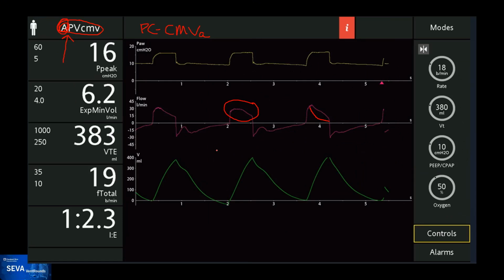But this mode is still composed of mandatory breaths. There is a set inspiratory time, and we can observe that we still have conflicts between the mechanical inspiratory time and the neural inspiratory time. In a few words, so you took off one of the handcuffs, but not the other one, right? Yes.